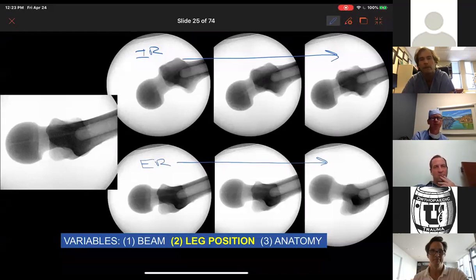And so you'll see the relationship of the greater trochanter is necessarily going to change, assuming it's intact, to the neck and the shaft. And you can see how it'd be really easy, if you didn't standardize your lateral, to start at a point which was not in line with the neck and the shaft and in the central or reasonably central portion of the greater trochanter, right? So collinearity, useful standardization of a lateral x-ray. All right.